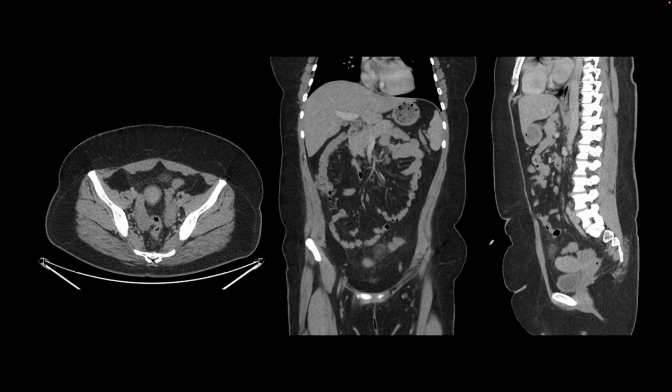And we see here on the multiple images the characteristic findings from epiploic appendagitis. So epiploic appendages are next to the colon. They can get inflamed, and the inflammation can look like this, where there is a central dot, and in other projections, you will find that the central dot becomes linear. So this is the thrombosed vein, and there is some loculated fat stranding around it. So don't confuse it with diverticulitis. This is epiploic appendagitis.